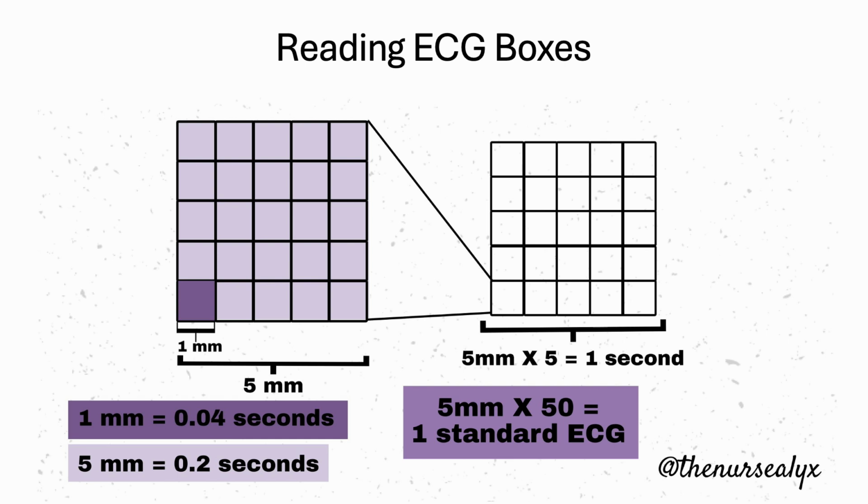So first, we need to basically know how to read the time on ECG paper. Every ECG machine is calibrated so that 1 millimeter is one box, and every millimeter of paper that passes is 0.04 seconds, or 40 milliseconds. We have groups of those boxes in fives, and that translates horizontally, going left to right, into 5 millimeters.